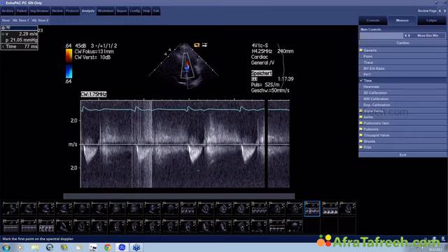So pretty neat thing. What is your job as an echocardiographer? Well, your job is to find these patients. We see a lot of these patients that come into our lab, and nobody's ever thought of implanting a CRT system in them. If you see them, take a look, measure the parameters I showed you, and refer them for further evaluation for CRT. Okay, so this was this case.